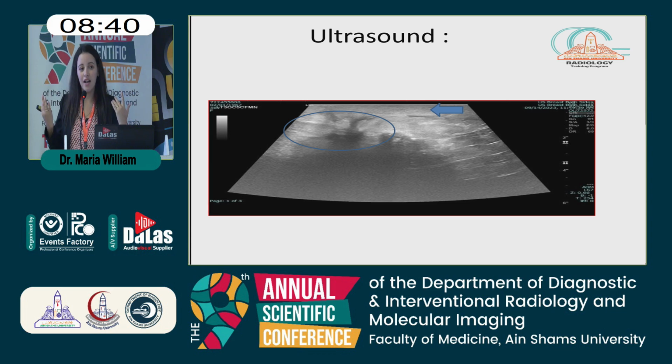We here think about 2 options. First one is a scar tissue or a recurrence tissue, okay? Then one of the most important indications of MRI is to differentiate between them. So what is the recurrence or the scar?